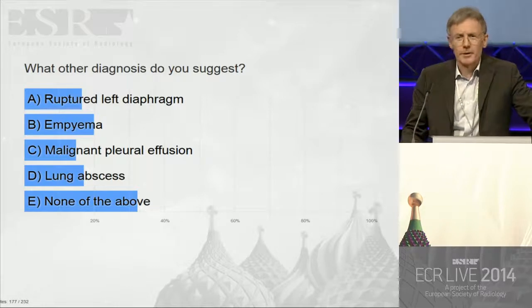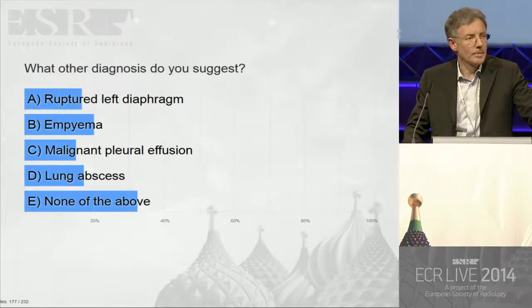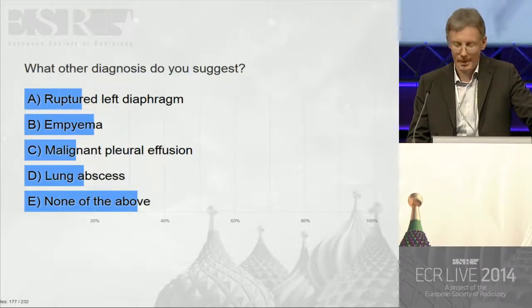The radiologist interpreting this chest X-ray was very worried that this patient had an empyema, but the patient had left the department after the chest X-ray was performed. This was preoperative for a cataract, so the patient was absolutely fine. And he told the technician, don't worry, I know I have an abnormality in the left chest. I've been told this for many years. It's nothing to worry about, so don't bother me with that. I'm going home. The radiologist was not convinced.